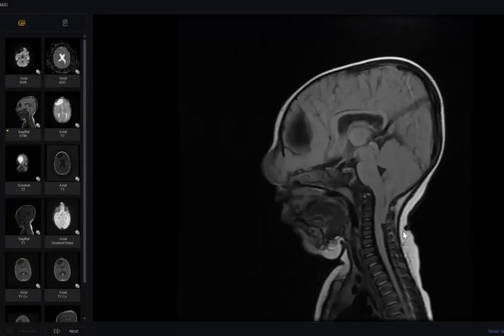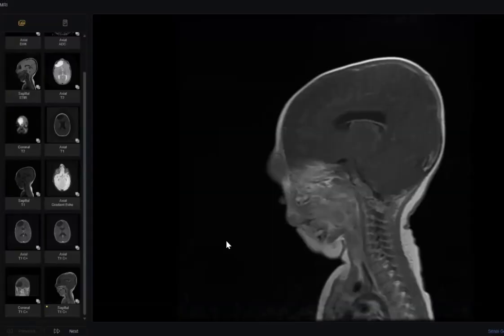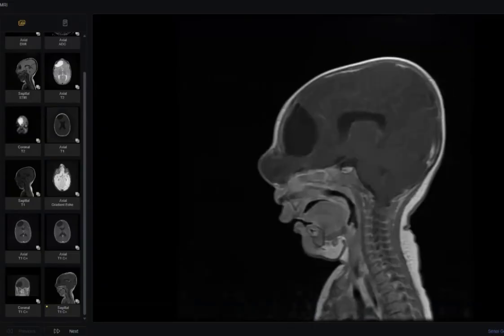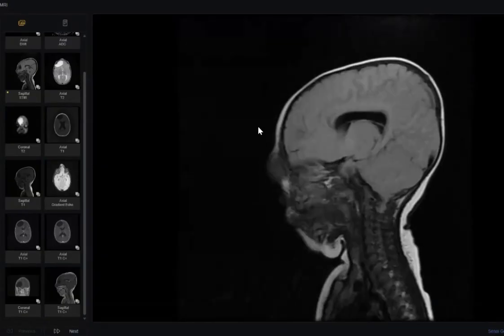Okay, and I think, if you notice, sir, there may be some dilatation here in the central canal, maybe. So yes, we can ask for a whole vertebral column CT or MRI to pick up any other anomalies. Thank you really so much, doctor. Another finding, but this time you missed it, but it is a minor finding.